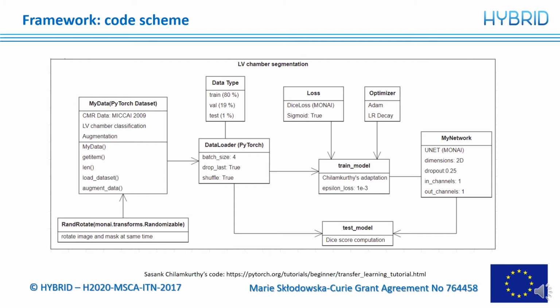And I also add the functions load dataset and augmentation data to properly load our MICCAI 2009 dataset.